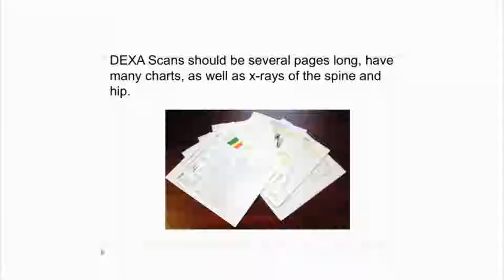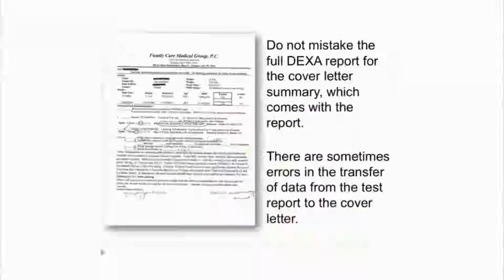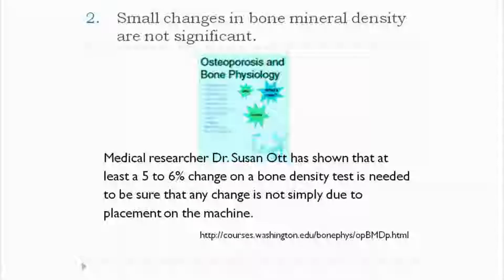Actually, the pictures may vary and the charts may vary from one report to the other, but it definitely is a multi-page report. You want that copy of the report. Do not mistake the full DEXA report for a cover letter summary which comes with the report. What you see on the screen here is an example of a cover letter summary. There are sometimes errors in the transfer of data from the full DEXA report to the cover letter, so you always want to have the full DEXA report. I say ask for the report with pictures and all.